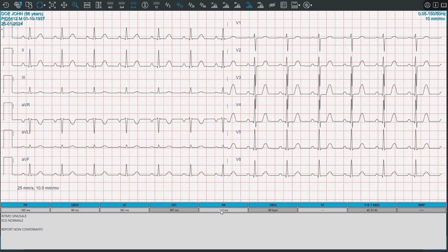To update a measurement, click its value to highlight it in yellow, then perform the measurement by clicking at the beginning, dragging the mouse horizontally or vertically as needed, and releasing it at the end. Only measurements highlighted in light grey can be updated. Please note that all changes are temporary and will not be saved after the session ends.